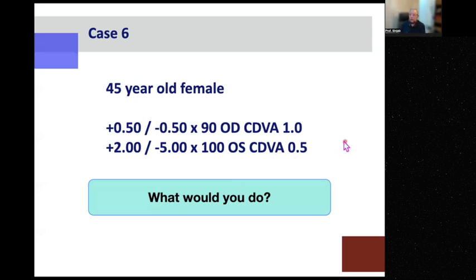Always, even if the patient is 45 or 50 or 60, you have to consider it progressive. We don't say we have to monitor progression because this is PMD. So you have to do cross-linking immediately. Even if you are planning for keratoplasty, do cross-linking. And the cross-linking, of course, should be decentered downward in order to cover the area of pathology.